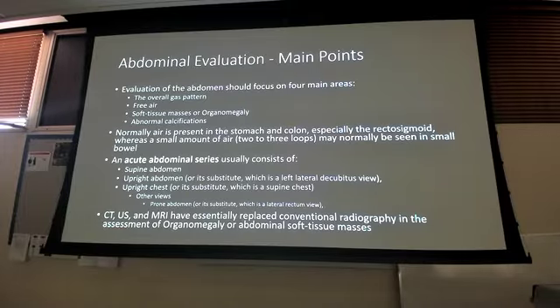What else should we have in the intestines? Stool. We'll use the official word. Stool, right? We should have stool sitting in there too. So we're going to see both. And there's a certain pattern that we expect to see in different areas.